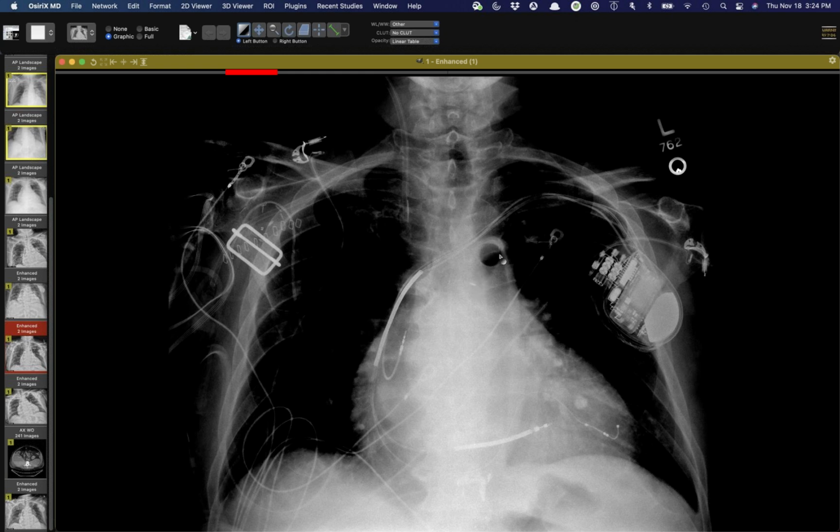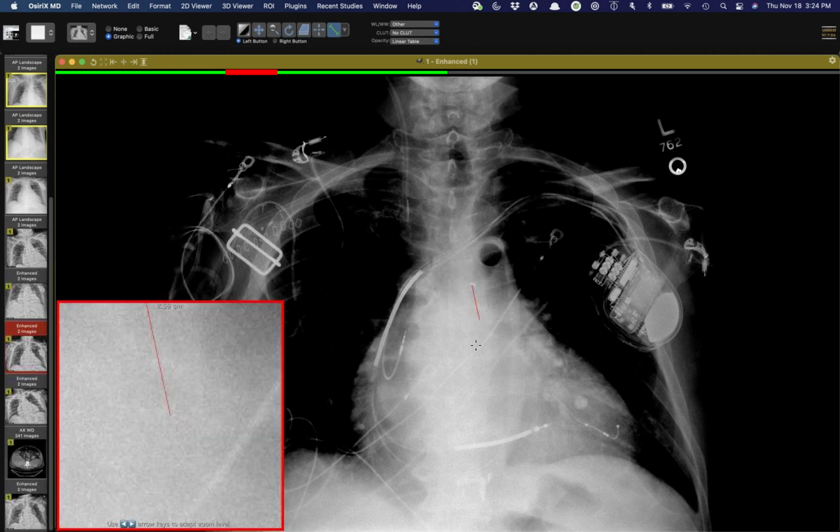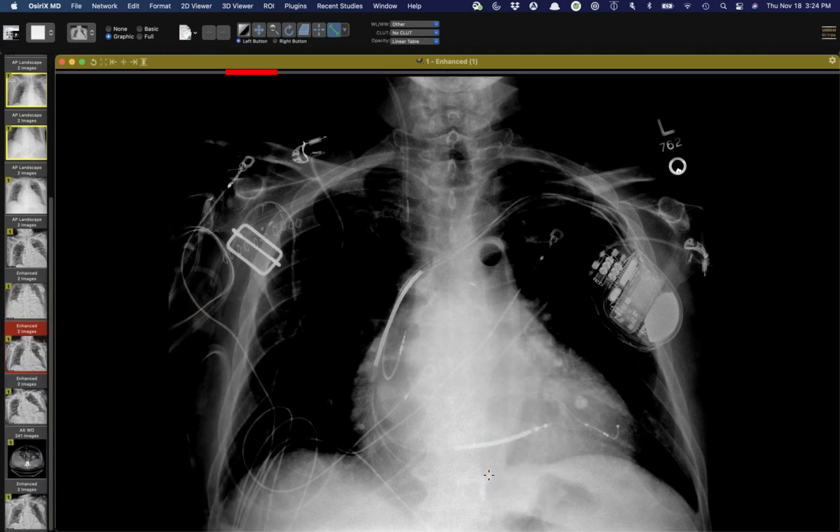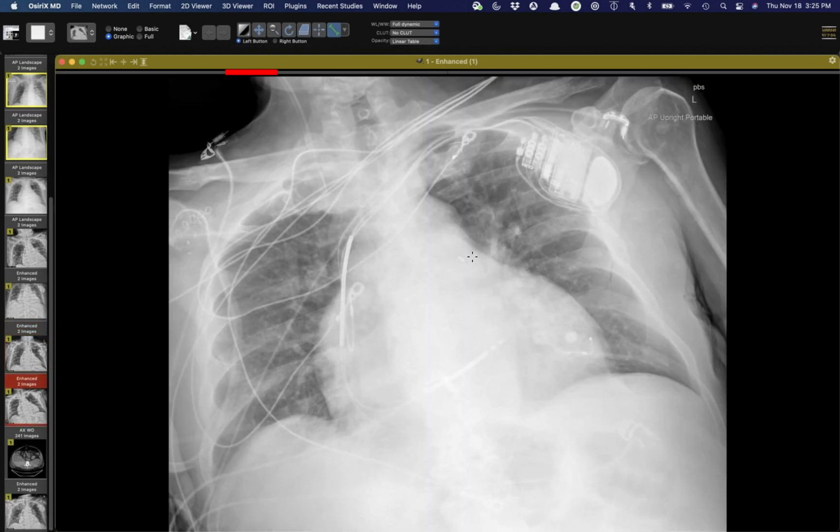This marker, you can see that the balloon is inflated in the arch. And as much as I try to even do some sort of curved thing, you can see the distal markers right here, and that's only about a 14 centimeter distance. So this is one where we called clinically, it seemed like it was too proximal as well. They actually advanced it a little, and they advanced it a little too far. This is just adventures in intra-aortic balloon pump positioning.